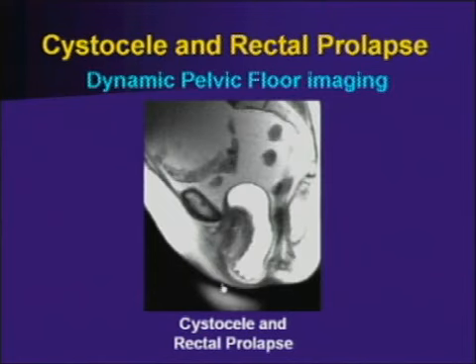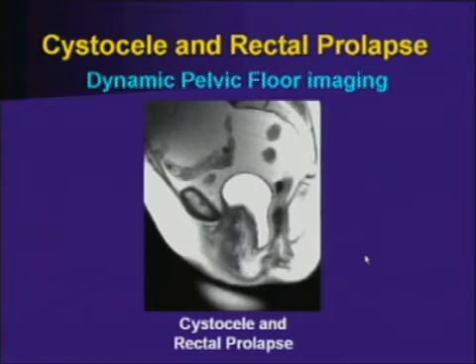We can also do dynamic pelvic floor imaging. Very easy, non-invasive tool to evaluate the integrity of the pelvic floor. This is just an example of a patient who's status post-hysterectomy with a large cystocele, as well as some degree of rectal prolapse, milder.